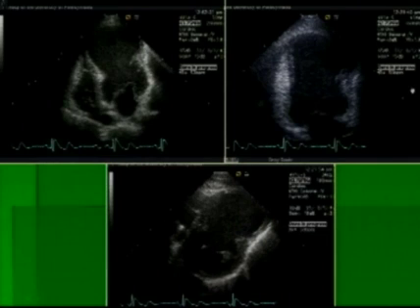Here's another example here. You can imagine that this patient would definitely have a predisposition to forming a mass or a thrombus within their heart. You can see the apical four-chamber view in the upper left-hand corner there. There's a massive aneurysmal dilatation of the mid-ventricle all the way to the apex. That's shown in a two-chamber view, somewhat zoomed in, in the upper right-hand corner. And then the short axis view is perhaps the most striking of all. It almost looks as if there are two ventricles, short axis, side by side in this particular case. It's an enormous anteroapical aneurysm.